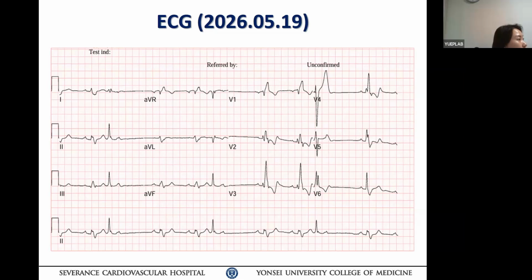Okay, good. So you think that it looks like a Mobitz type 2 second degree AV block, but is more likely related to the preceding PVC. And the unusual thing is the PVC QRS width is narrower than the baseline rhythm RBBB. Yes. Okay, I agree that the baseline rhythm is sinus rhythm with RBBB, and yes, there is a notched P wave.